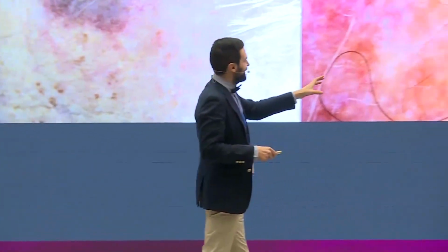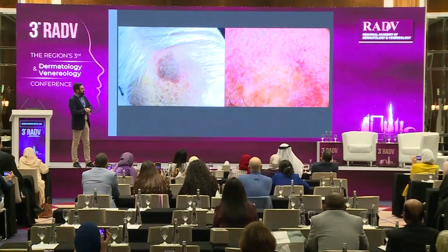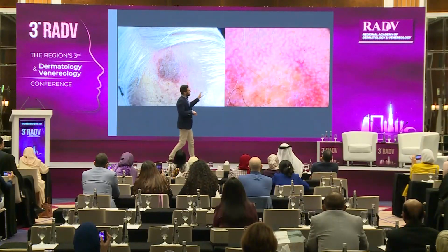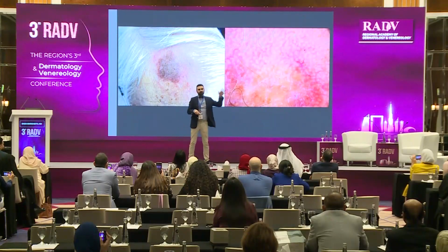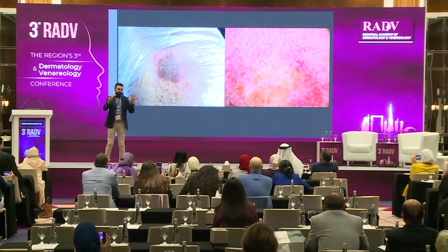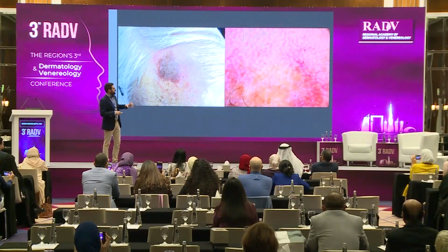Which color do we see? Orange. No, yellow. Come on, it's orange. Okay. And then, what do we see? Vessels, yes. There are some polygonal vessels, but he also has maybe a little bit of rosacea. They are not significant.